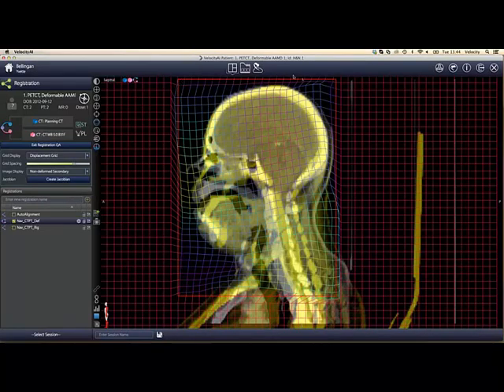So this voxel moved in a direction, and it displaced by more or less 16 millimeters. And if I move back to this little one, you can see that this displaced by around 6 millimeters. All right, so this is another way of viewing it. And once again, always view it in all the areas.